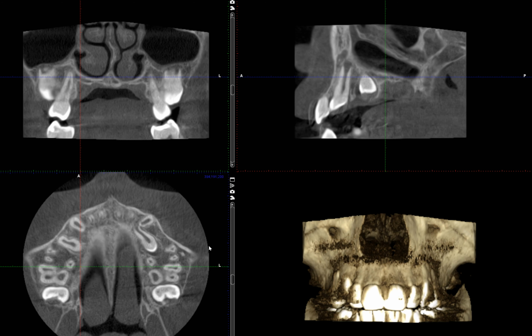Once again, if you look to the top, premolar and canine, and we are still yet to see the other premolar. So in order to find out where that is, and also to see its spatial relationship and assess the root conditions of this heavily crowded area, we took a cone-beam CT, and that's what I'm going to show you now.